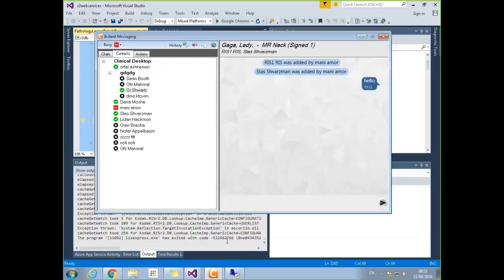For users who are not used to it like us, we don't like the context because we think you don't need it actually. If you go to the chat, you have the plus button, and you can create and add groups and add users. It's just cumbersome. And if you think about WhatsApp, what you have is a stack of the most recent chats you've been to, the people you naturally speak to more.